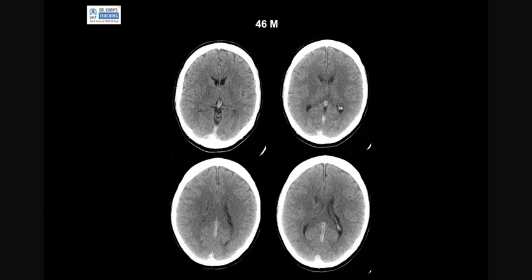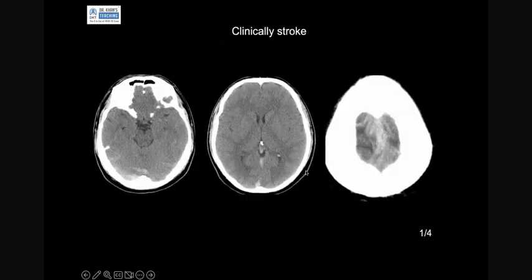Sometimes dural venous sinus thrombosis can be seen on a non-enhanced CT as a thrombosed vessel, just like a thrombosed artery can be seen in cases of stroke, like hyperdense MCA sign, or hyperdense basilar artery sign. So in this particular case, we can see that the internal cerebral veins are hyperdense, and the straight sinus is hyperdense, and this is the confluence of sinuses, which is hyperdense.